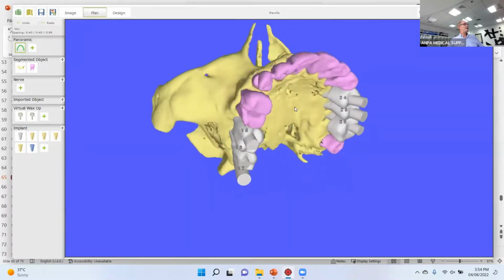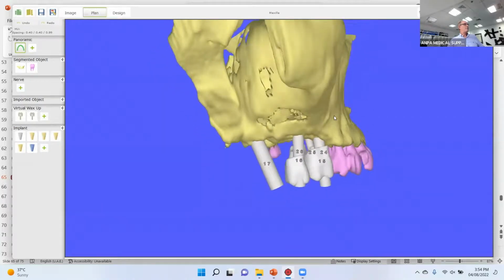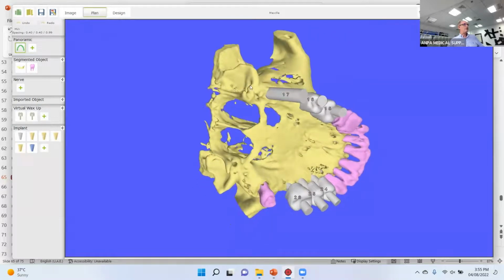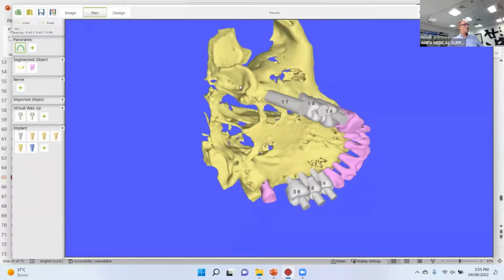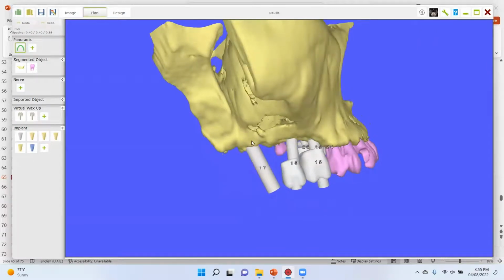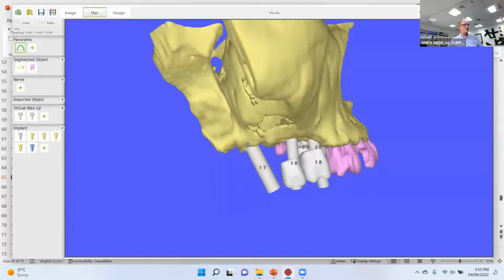The implants have been planned, and the implant I want to put here is in between the pterygoid wings, the maxillary bone, and the tuberosity of this bone in between. You have three kinds of bone here. There is no risk. There are no big arteries, nothing. There are just muscles, okay? So when you place implants, they are very strong. And the prognosis is very good to place implants at this level.